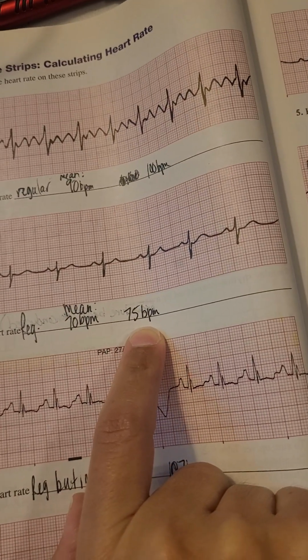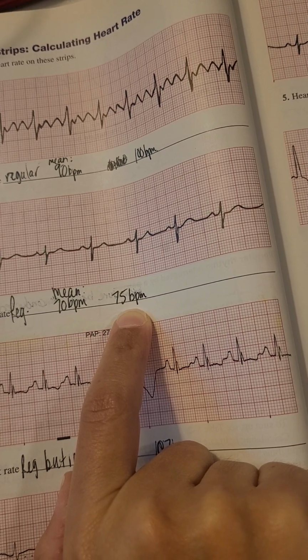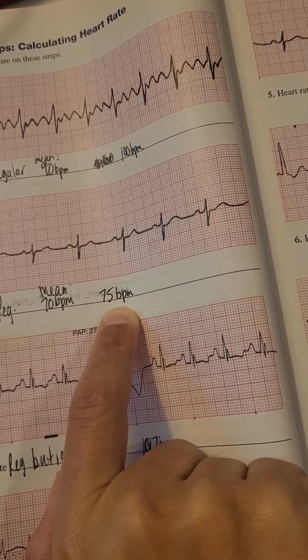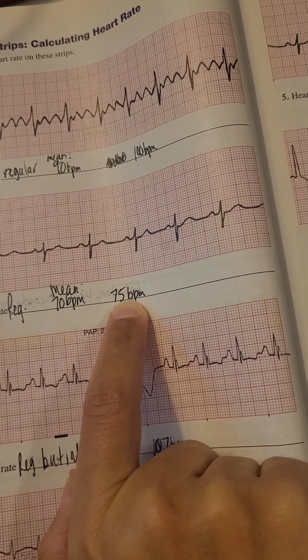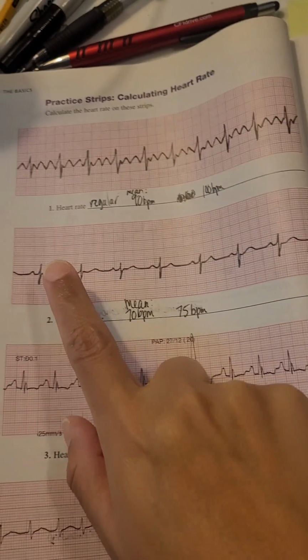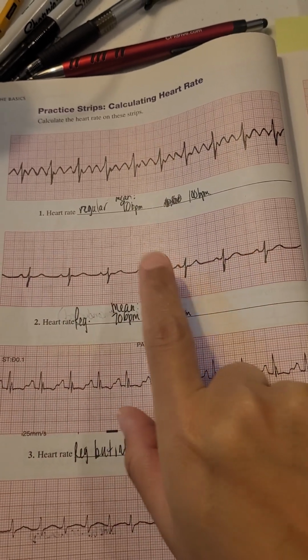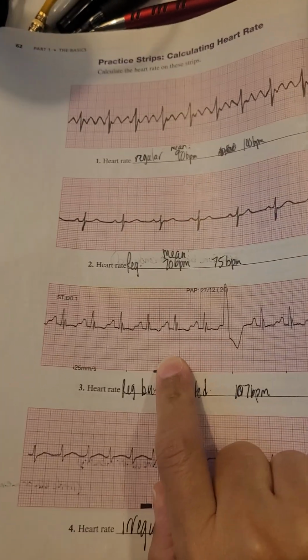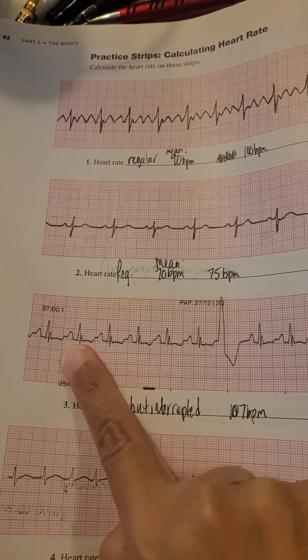I might have done the other type of calculating of the heart rate, which gave me a specific heart rate before. Now, because I worked in the hospital already in other places, I just go straight to counting them and times 10, and that's it. But this is regular. This is also regular.